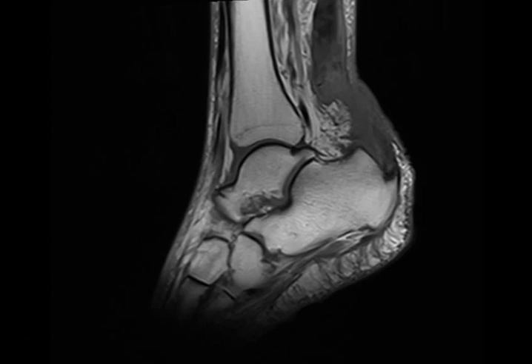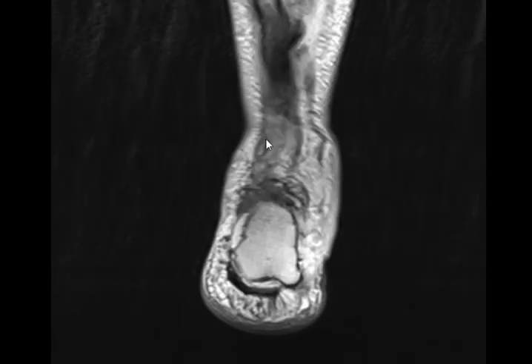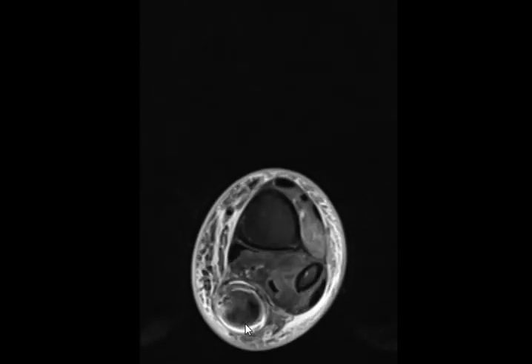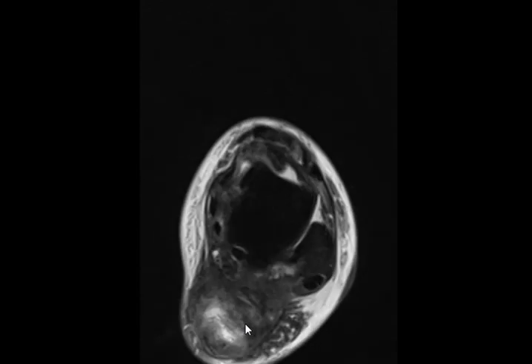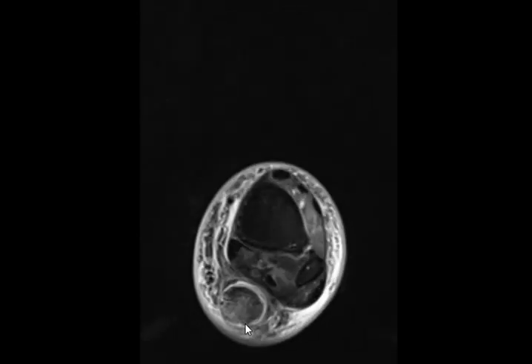Exactly. And we can see it on the coronal image. There is a big gap here from here to here. It's all tendinous. And if you go to the axial image, you can see this is the muscle, okay? And suddenly it disappears, very beautifully demonstrated on the axial T2 image. This is T2, okay? And you can see the subcutaneous edema here and there, okay? So it's a very straightforward case of Achilles tendon rupture.